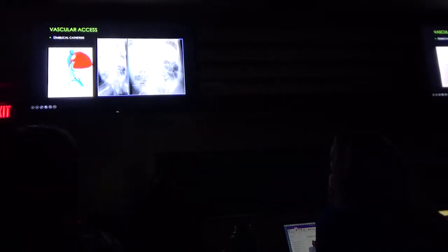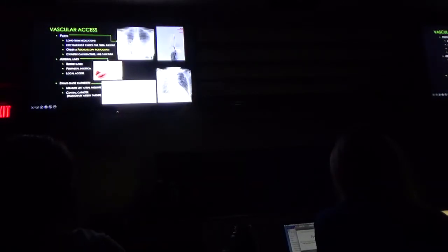But if you just got this view, then you say, do it again, I need the whole view. Do not ever be satisfied with not being able to see everything you need to see. This one obviously went way past the point of where it needed to go. We're done with the baby.